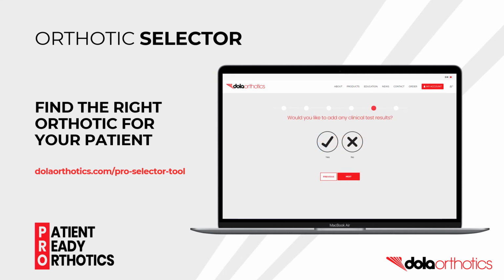Would you like to add any clinical test results? This section allows you the choice of providing additional clinical test results. In this example, we selected no and will continue. We will explore additional clinical tests in later examples.